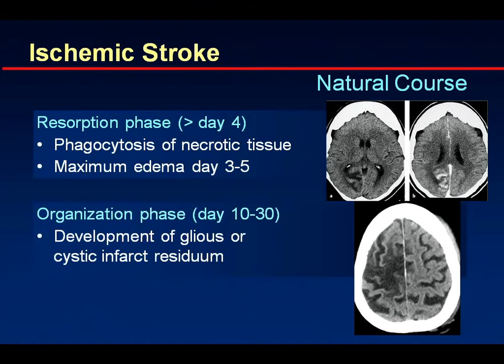herniation of the brain. If you do some imaging during this time and you decide to give contrast, you will frequently find these enhancing areas because of the leukocyte infiltration, which is now so strong, and the loss of the blood-brain barrier, that you do see contrast enhancement in this region, which at some point will make it difficult to distinguish that from a tumor. So the classic anamnesis plus the imaging on the non-contrast scan is enough.